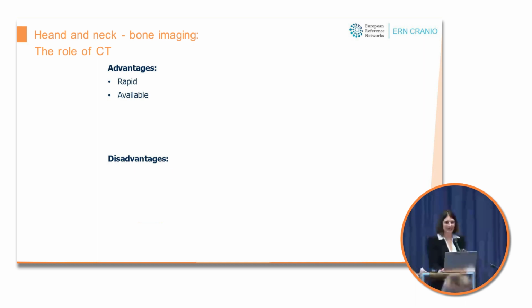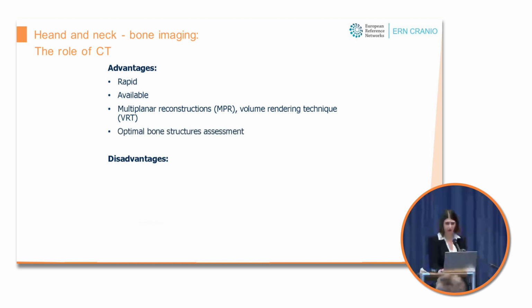And it allows to automatically reconstruct multiplanar and bone rendering images that aid both the diagnosis and the surgical planning. Also, CT provides an excellent assessment of the bony structures.